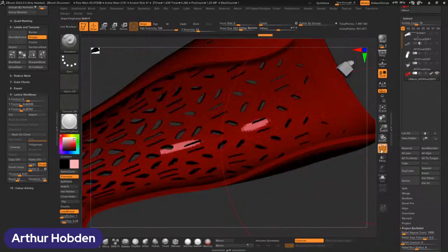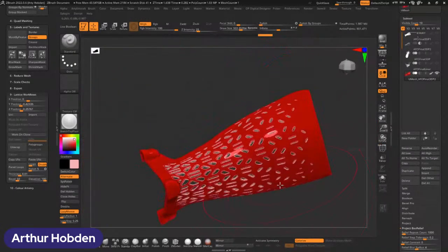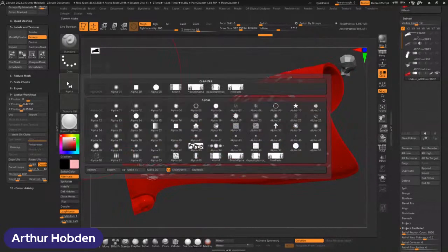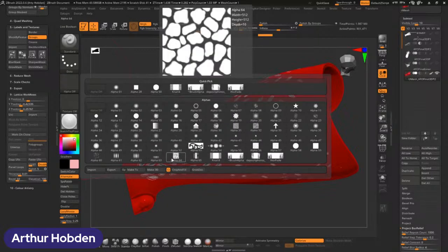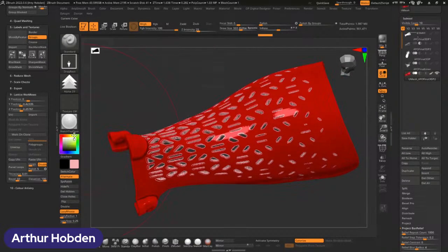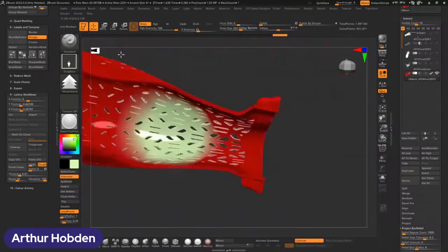Come on, give me the group. Oh, there's no more groups. Okay, you can use groups, rest assured, so you can isolate groups, make groups, and then paint by groups. You can also paint with alphas, which is very interesting. So say you want to create a stamp from your company logo. You can find a stamp of some shape. You can bring it in as an image file and drag a rectangle sort of that shape, and you can bring it in.